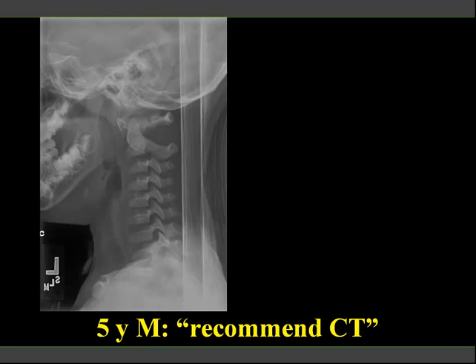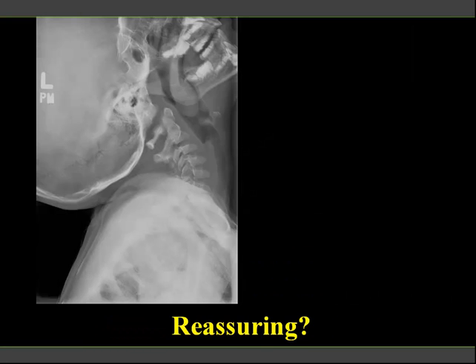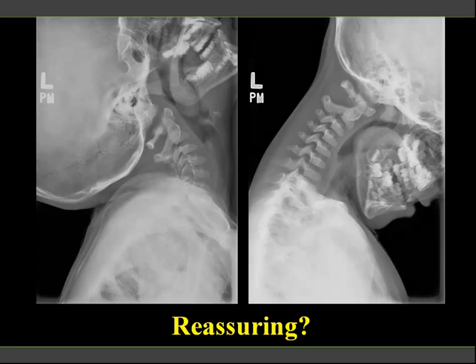So we were confronted sometimes with difficult situations. A 5-year-old boy. The emergency radiologist was not quite familiar or at least comfortable with this image, and wondered whether there was an increased distance here. The CT is just another image of the same finding, basically. There is surely a large distance there, but we then let the child, and this is something the child has to do on his own without assistance, do flexion and extension views, which show the normal mobility at this level. So this is again a completely normal finding.